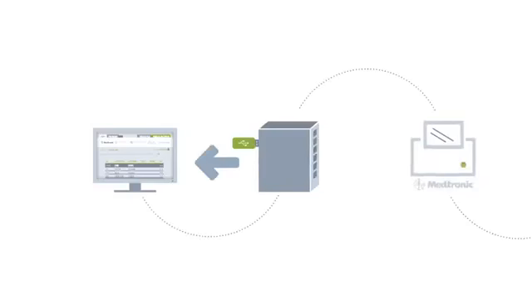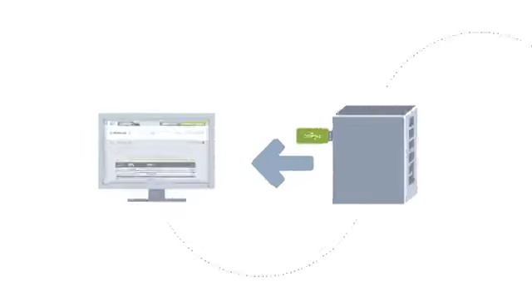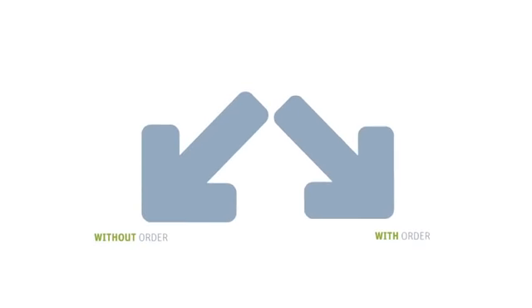This activates the import process. The data is now sent from the USB stick to the PC. A new window pops up presenting the results. This window is the internal viewer. It will be discussed in more detail later. The data import process will be slightly different if the examination is part of a previously created order.